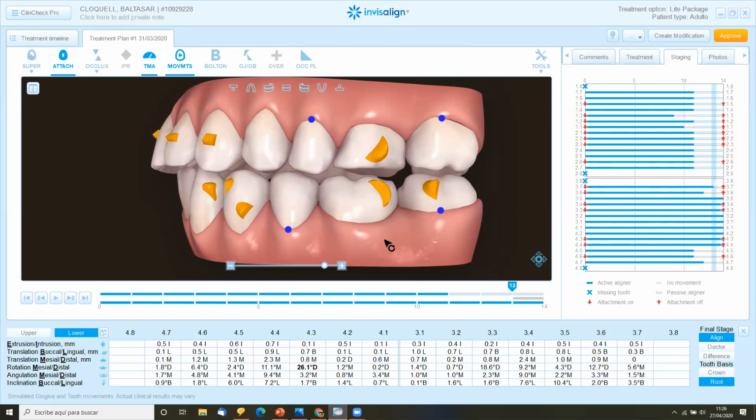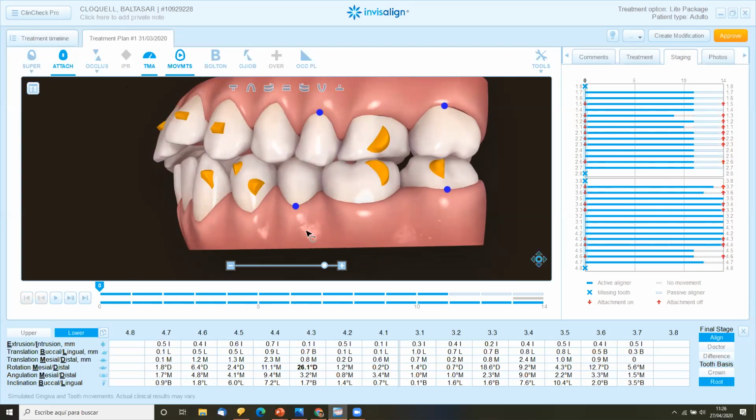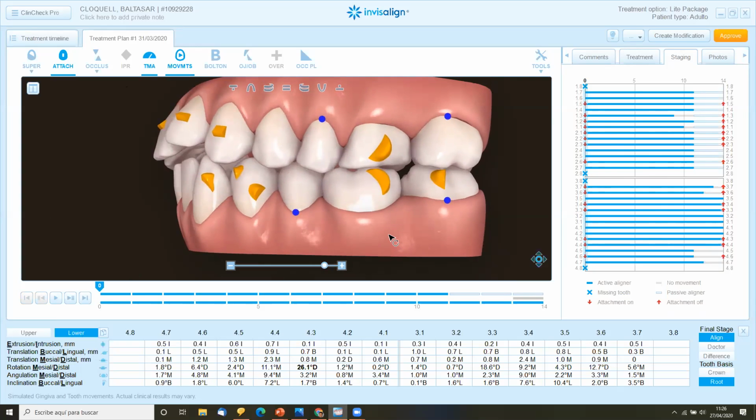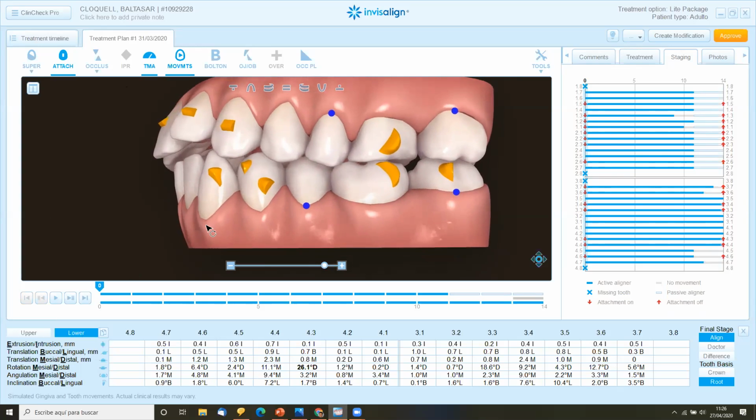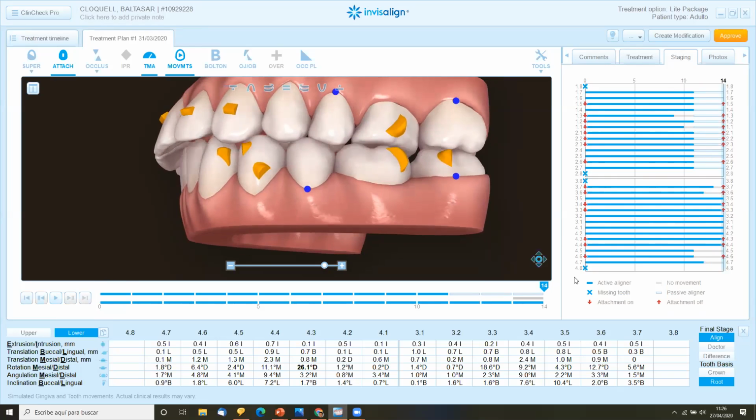Then, last point of the first part of my protocol, point number 6, is final occlusion. Am I going to stop here? No. Why not? Because it's treatment plan number 1, and I'm changing it because I always work out my plans. I never accept, or almost never accept, treatment plan 1. So I'm not wasting time here.